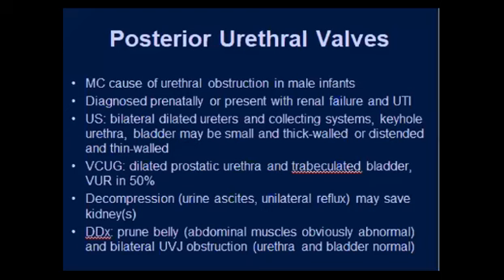Like this one. So what happened here? You can see the bladder trabeculated and hypertrophied. Then the bladder neck is even hypertrophied. You can see the demarcation between the bladder and bladder neck and the posterior urethra, which is dilated as you see here. Bilateral reflux, massive reflux, and hydroureter. Is it easy? We can shift.